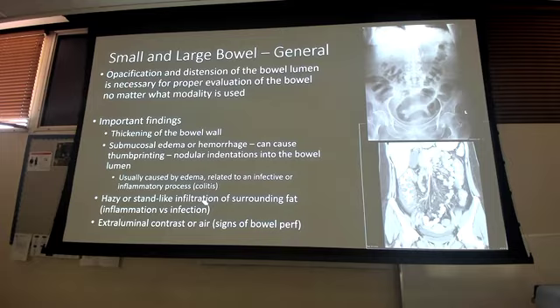Another thing you're going to see, right, use your imagination at first when you have these issues, is all of these extra little lines in that dark gray radiolucent area. So you see all these radiopaque lines, not necessarily the ones off the vessels, right? That's my vasculature. But look at the ones in that dark gray extraperitoneal fat area.